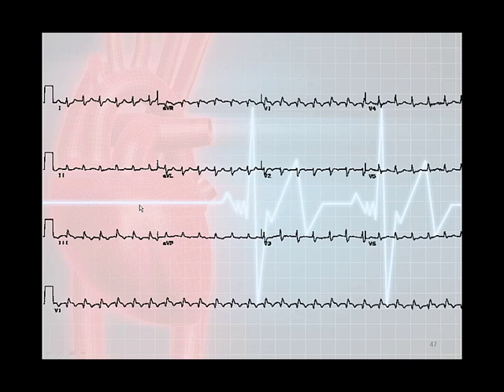This was, at the time, the best 12 lead I could actually find, but we'll go ahead and look at this. This is a person who truly is actually having a pulmonary embolism. This EKG was gotten off a patient who is having a pulmonary embolism. This is your S1, S wave in lead 1. This is your Q wave in lead 3, and here's your inverted T wave in lead 3.